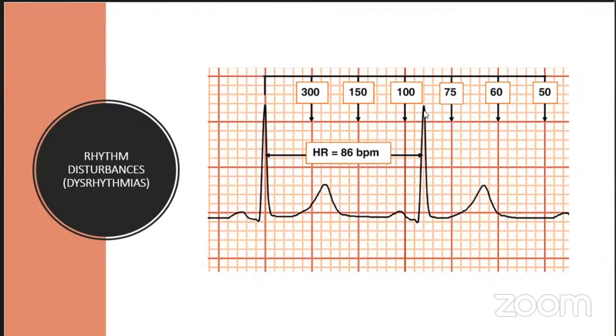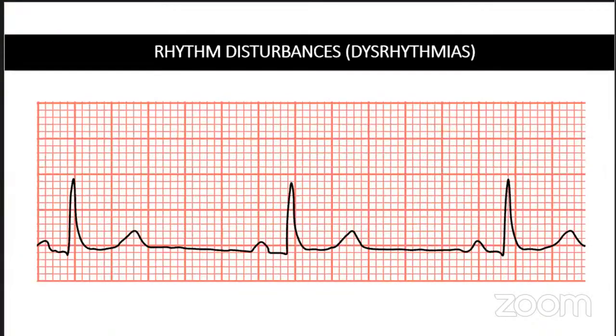Okay, so I'd like you to use the same formula and tell me what you think is the patient's heart rate on this reading. So again, this is already on a tick line, so you can use this. What does this patient's reading look like? What do you think the rate is? So I'm going to give you 5 minutes just to write your answers in the chat box.